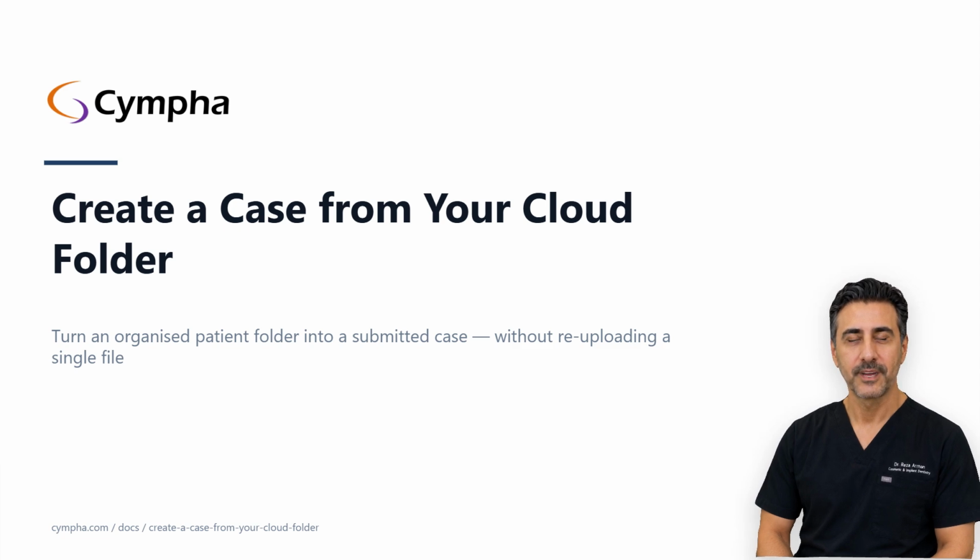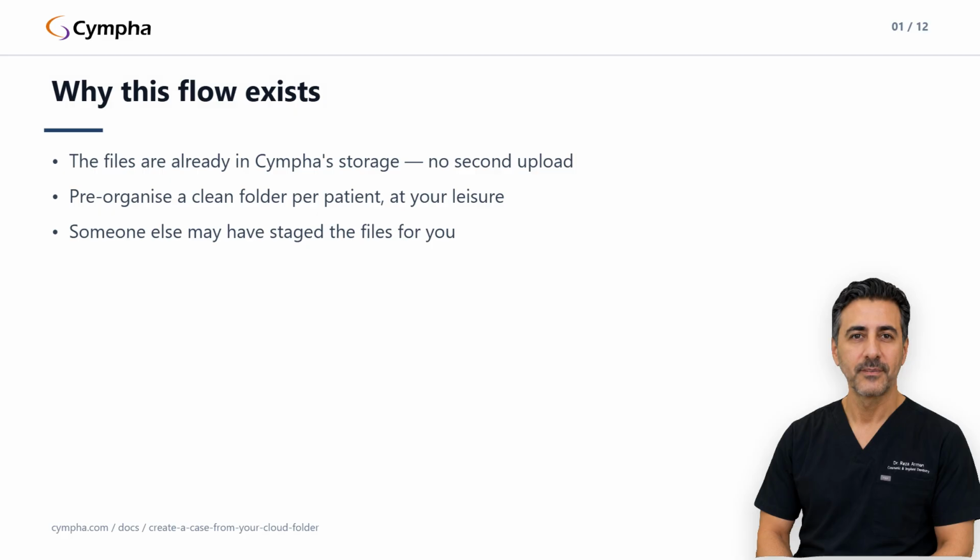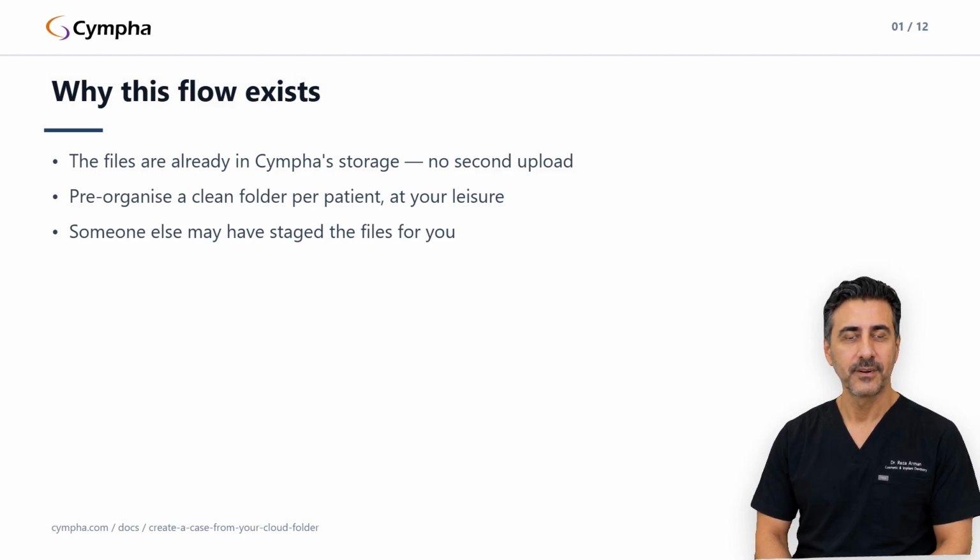Why does this flow exist when there's a perfectly good new case form with an upload box? Three reasons. First, the files are already in Cympha storage, so pushing them from your cloud to a case moves no bytes from your laptop, which matters on clinic networks and matters a lot for cases with many files.